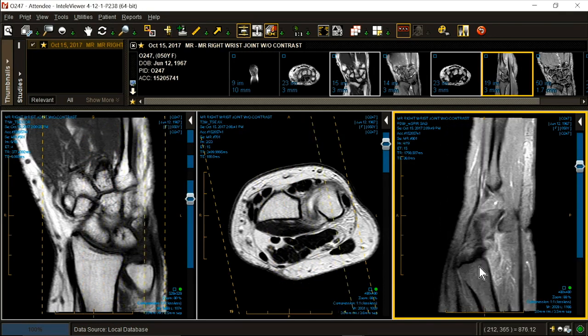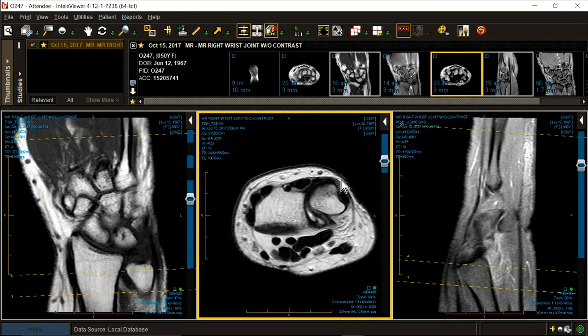A little dorsal, huh? How many times have you missed this on a lateral x-ray? Many. I know I have. But this is a very debilitating injury, if not dealt with early on, because once you develop radioulnar arthritis, game over. So where is the radioulnar view? It came later. We brought the patient back and did steep pronation, steep supination views, and there was radioulnar instability.